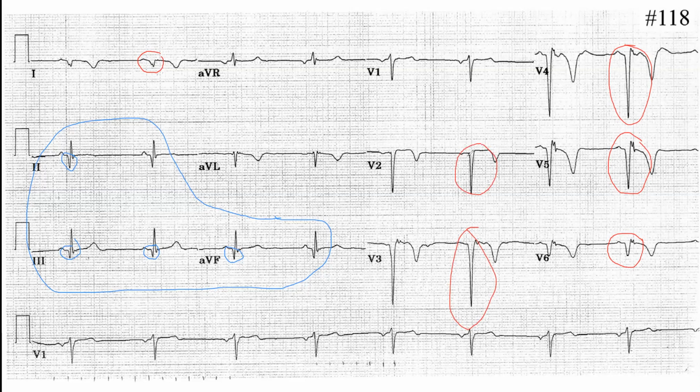Now let's see the ST segment. It's only 1 millimeter here, all right? So it's 1 millimeter. It's not more than 1 millimeter. So it's nothing.